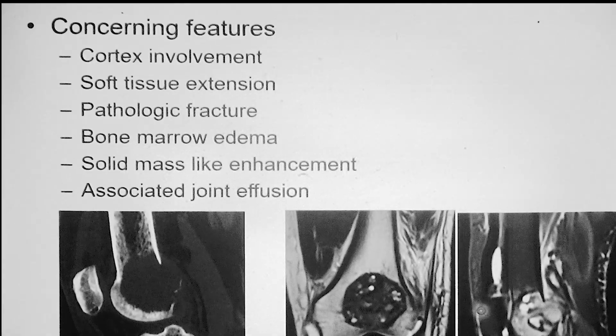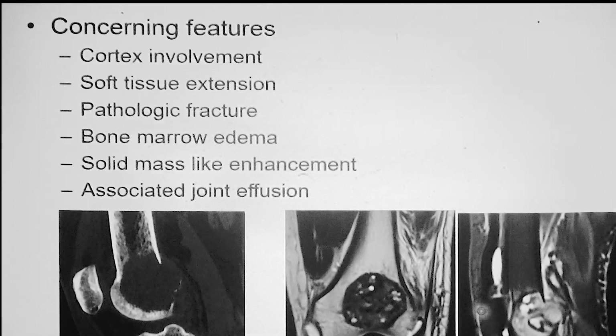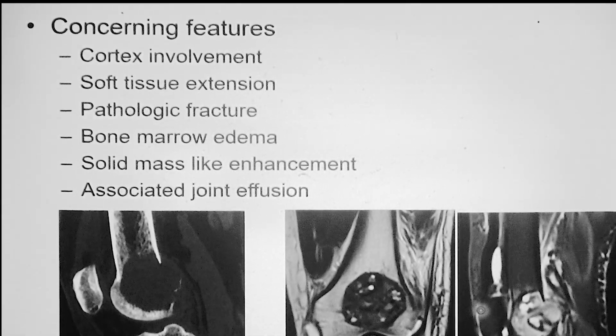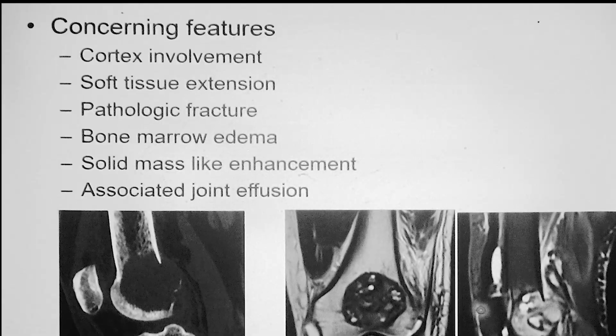A giant cell tumor was there, but there is something missing here. The X-ray doesn't go with the giant cell pattern. Usually the giant cell pattern has a reference. It is a very rare presentation like this. A GCT will not get periosteal reaction until late in the disorder. It doesn't happen with a small tumor, and it doesn't get into the soft tissues.